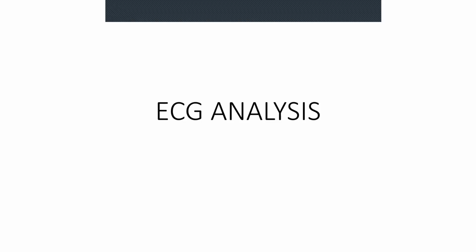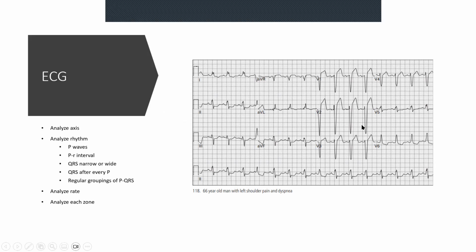I'm going to cover an ECG today and cover a topic that I think gives a lot of people nightmares whenever they see ECGs like this. Without further ado, let's just have a look at the ECG. We're going to analyze this ECG, and I've noticed over the last few years that when you get an ECG that looks like this, everybody kind of panics. That's the first thing. They panic and they immediately shut down.